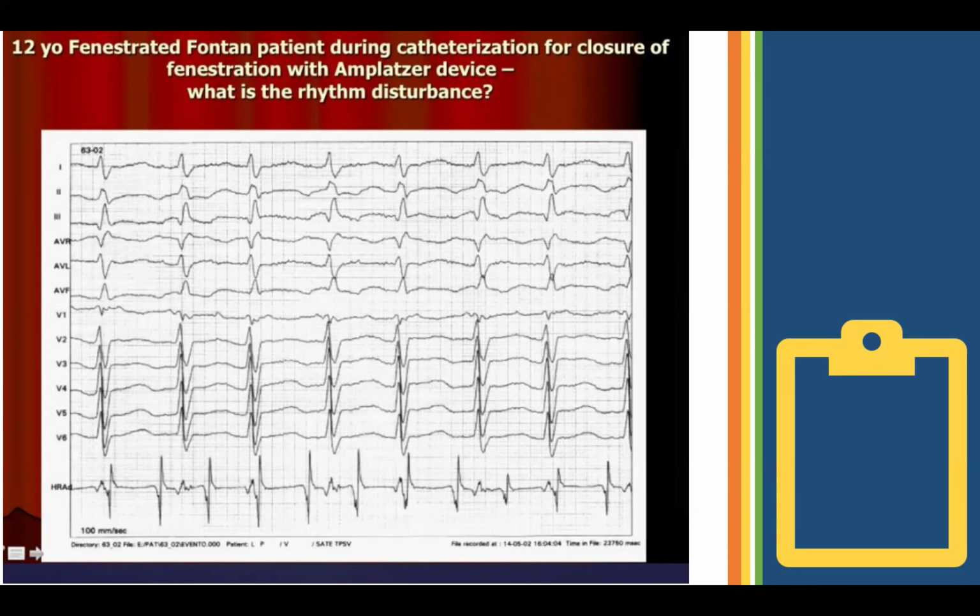All right. So I can't really tell in the next couple beats if there's a true P wave. I don't really see a clear inflection like I do see in the second beat, in the third, fourth, fifth, and sixth. So perhaps these are just ventricular. I would remind you that you have a high RA catheter also. All right, thank you.